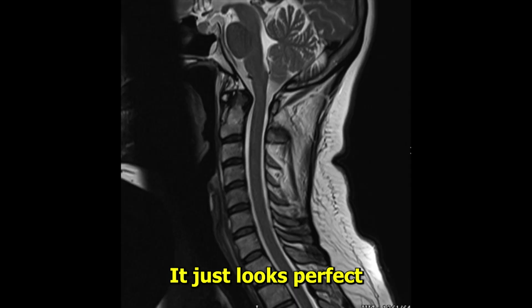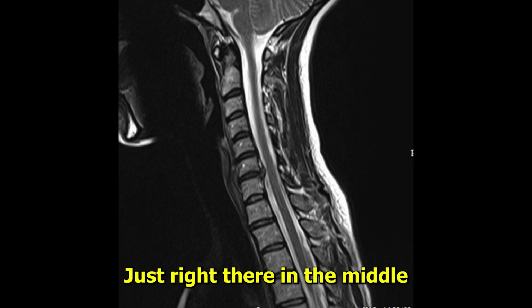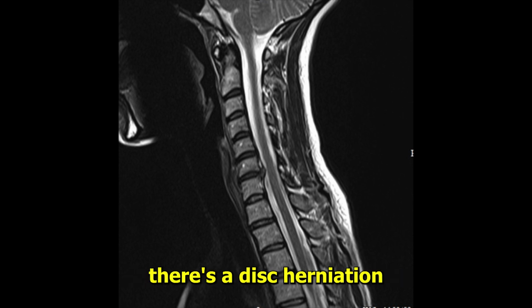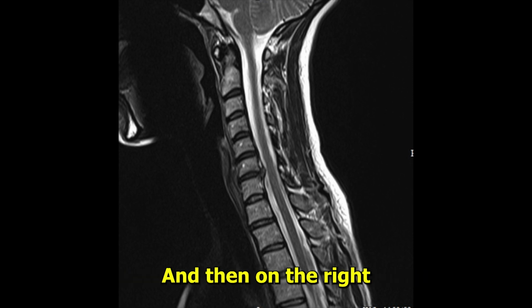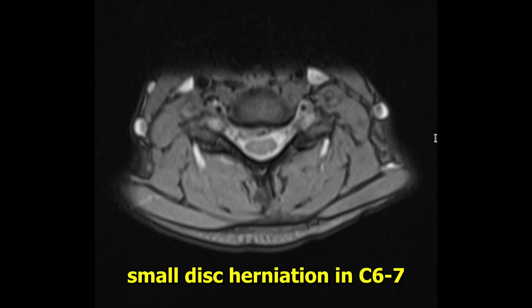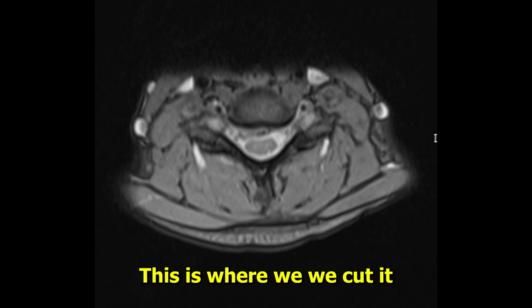It just looks perfect. And this next one, you'll see a disc herniation. It's C3, 4, but C6, 7, just right there in the middle. There's a disc herniation distorting the spinal cord just a little bit. So that's very different from the normal we just saw. And then on the right, you'll see this small disc herniation at C6, 7 on the right on the sagittal view. This is where we cut it, like a cross section, like you're cutting a sausage.